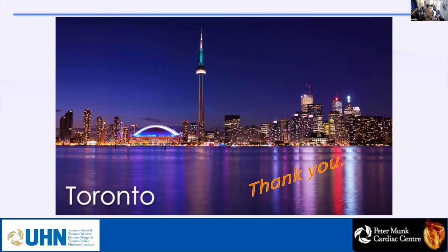But if this bicuspid is very asymmetric, you might make a very good ovoid shape, but this ovoid shape will not be at the middle of the circle. It will be at one corner of the circle, so it will be stenotic. That's the reason that any time a valve is very asymmetric, you can repair it, but you will have AS post-op. Because when I saw the picture, when it's open, I thought it's bicuspid. I said, did they repair it? So it is bicuspid.